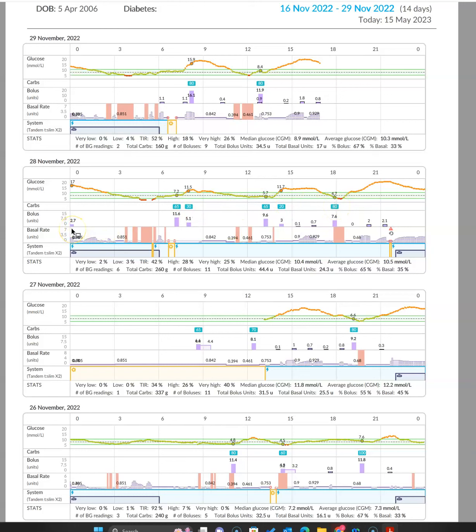And then on the bottom, we can see where this is a correction bolus of 2.7 units for the high. And then you can see carbs and insulin. And then you can see these little ones with the dark bit on the outside there, where auto corrections have kicked in, where the glucose level is obviously above target, and some auto corrections here as well.